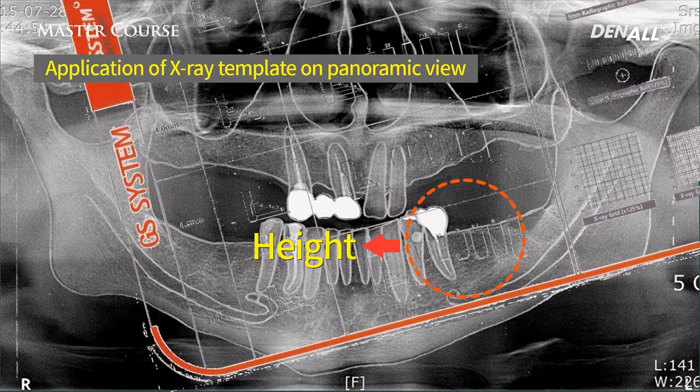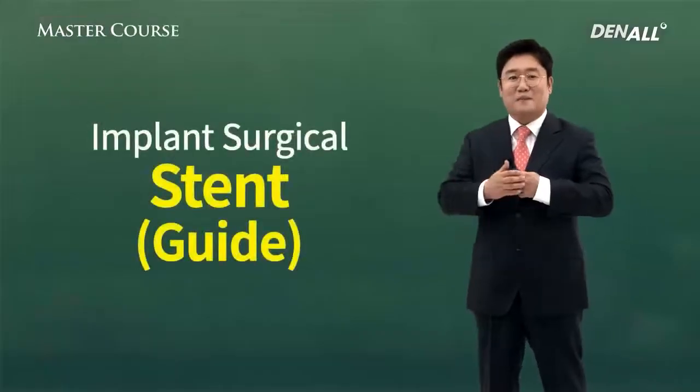The transparent paper is put over this. 125% magnified pictures are there. Implant fixtures need to be selected, fitting that height of bone. Anatomical structures need to be avoided when we choose the implant fixtures. Maxillary sinuses or inferior alveolar canals need to be avoided when we choose the implant fixtures.